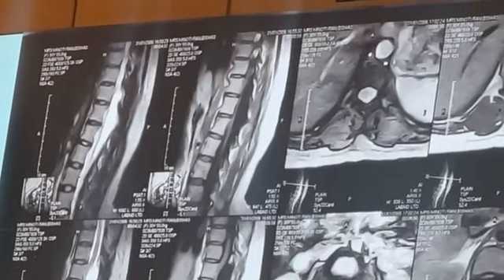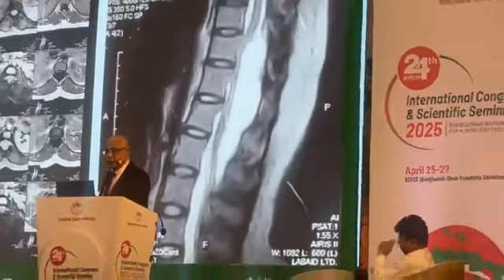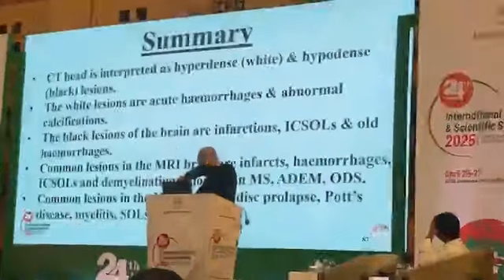This is a neurofibroma, as I said, T1 hypointense, T2 hyperintense, lobulated, outside the spinal cord, but compressing the spinal cord a lot. Neurofibroma of the spinal cord. Right, so that's all I wanted to say. Hopefully I am on time.